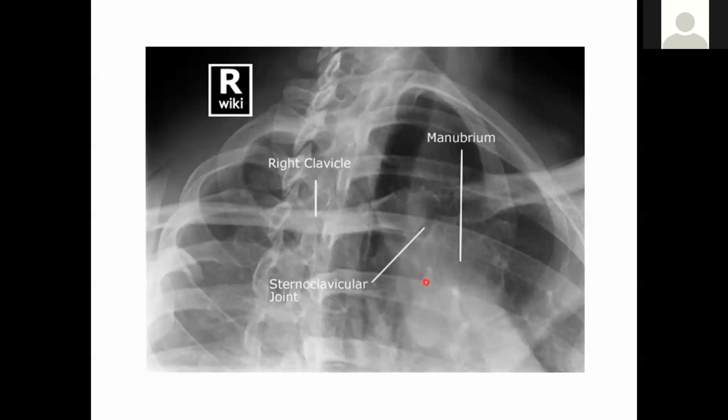This is just a lot more field than you need, and it's off-center. It's pretty much centered directly over the patient's back rather than the area of interest. So don't rotate them very much and collimate down. Just centered a little toward the upside.